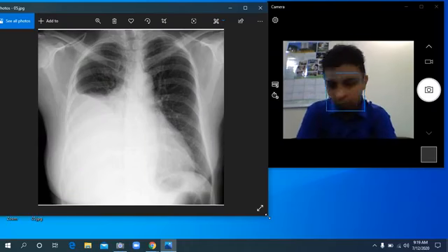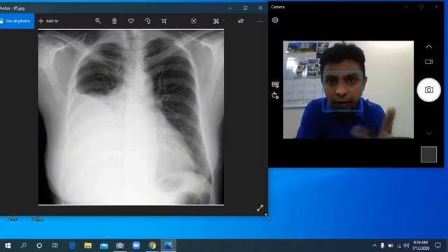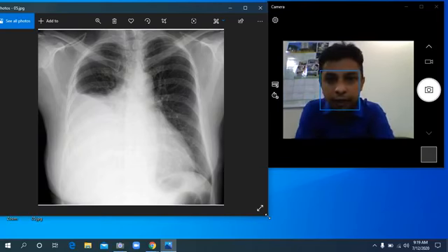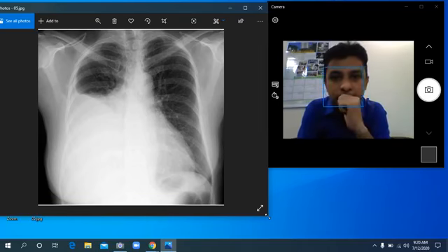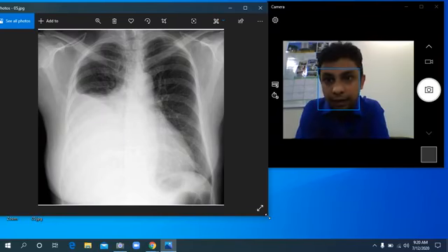So I hope you can remember the basics that we check when examining an X-ray. So in this chest X-ray, first of all, you should check the side of the X-ray. Even though there is no inscription such as R or L in this X-ray, from the position of the fundic gas over there, we can tell that this side is left, and from the position of the cardiac apex, you can also determine which side is left and which side is right.